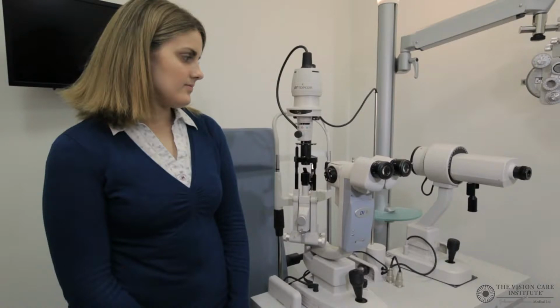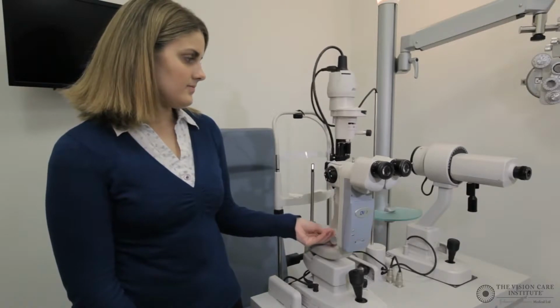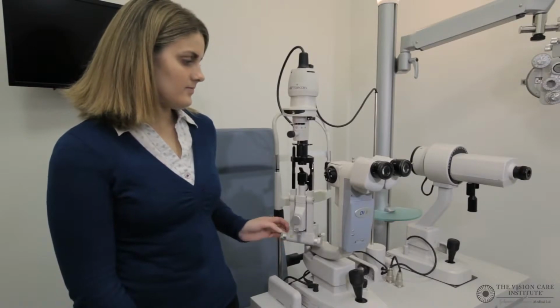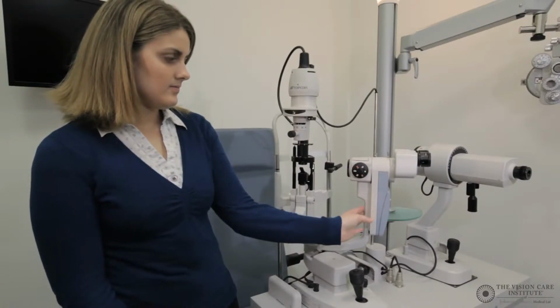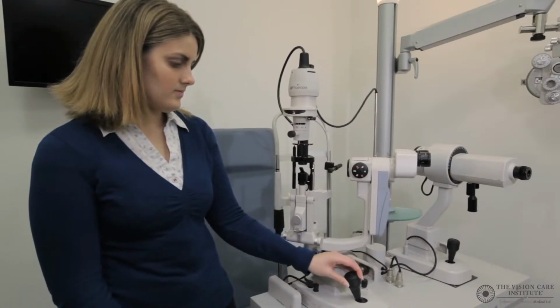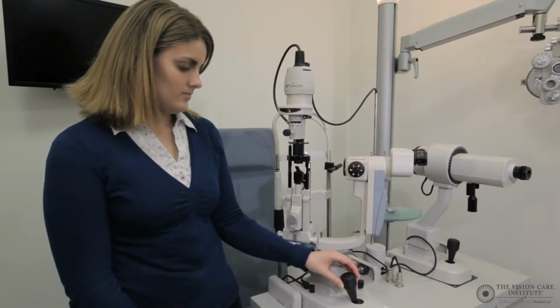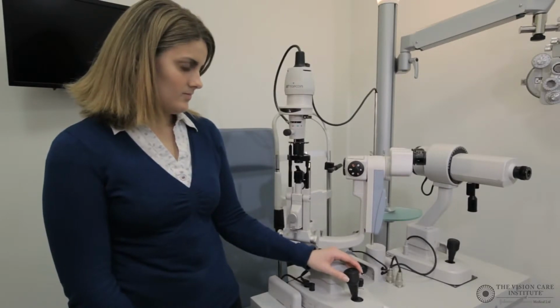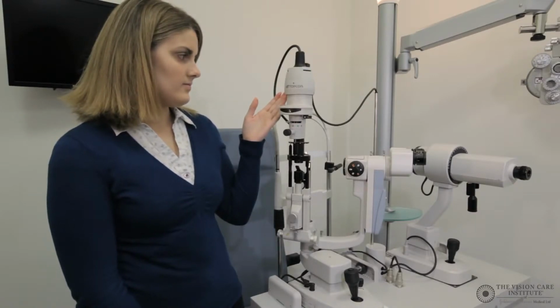This slit lamp is a Haag-Streit copy, as the illumination system which is being rotated here is at the top. Besides the illumination system, the other key component is the observation system, which is being rotated here. These two systems are joined by the third component, the mechanical system, so the illumination and observation systems can be linked. We can see here how the illumination and observation systems can be raised up, moved sideways, or front to back in unison. The illumination system is made up of a light source, which is housed at the top here.